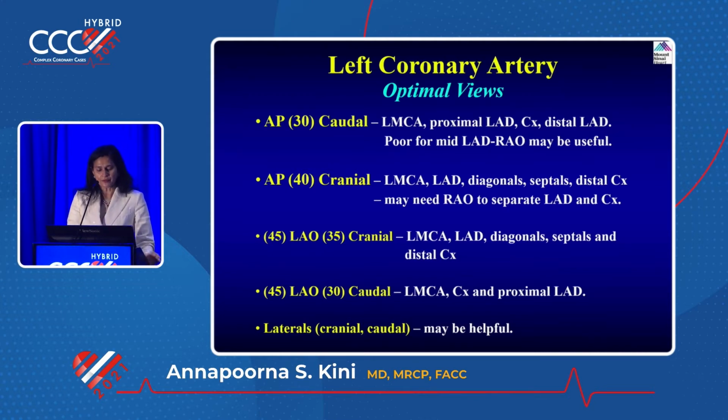What is the best view for ostial left main? Straight AP cranial, because in the cranial view, not for the distal. So many people confuse RAO caudal. Okay, RAO caudal is always for the left main. I think we have to make it distal left main. Ostial left main, cranial view if you're stenting. Why these views are important for intervention is not just angiogram, understanding whether there is any stenosis. Important also when you're stenting, okay, which view you want to use when you want to nail the ostium.